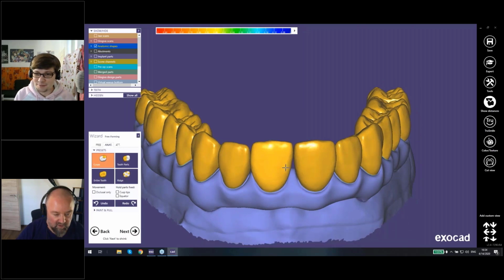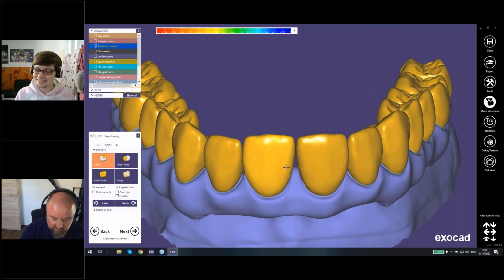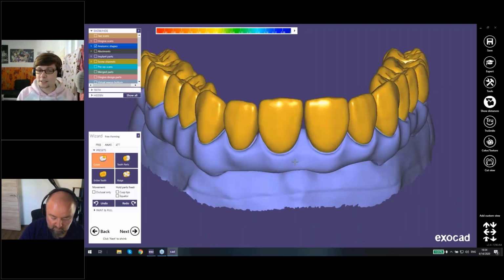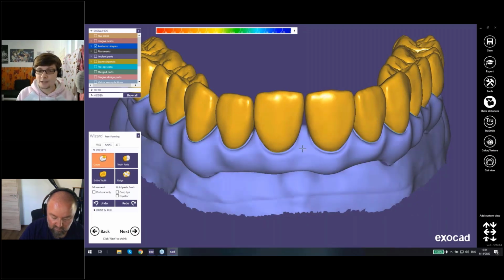So I will ask. I think they're asking if it's possible, after you create copings on the thimble bridge, to also save the top part, the anatomy part that was cut, for a pressed restoration? The easiest way to use this is to save the anatomy itself as a wax up and then redo the anatomic part as a wax up.